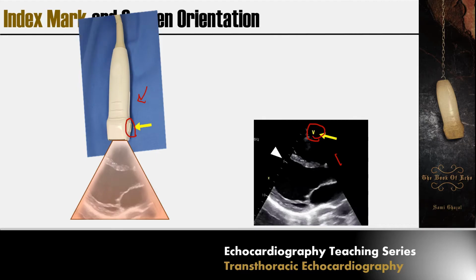The presentation of the notch is usually a symbol or a letter depending on the vendor. So this side of the image will always be presented on the right side of the monitor. Sometimes it is flipped, where you can see the symbol on the other side, but this is not the standard.